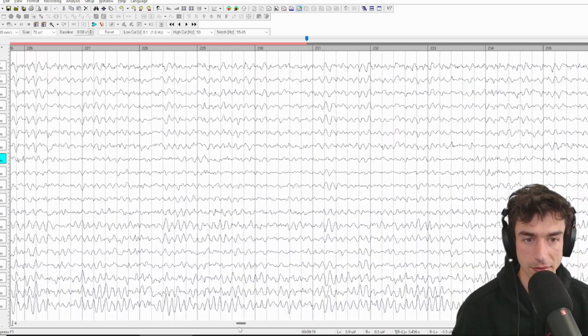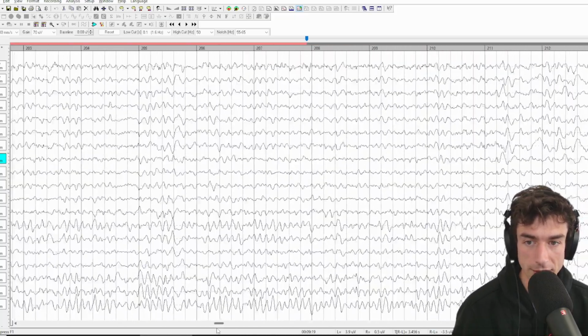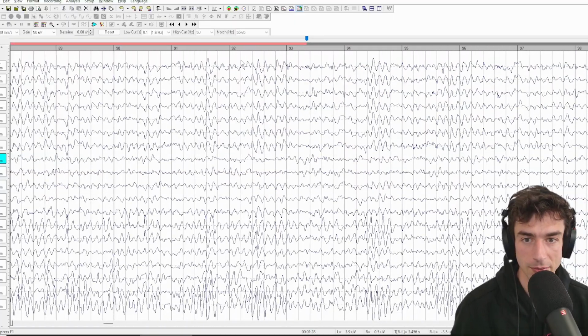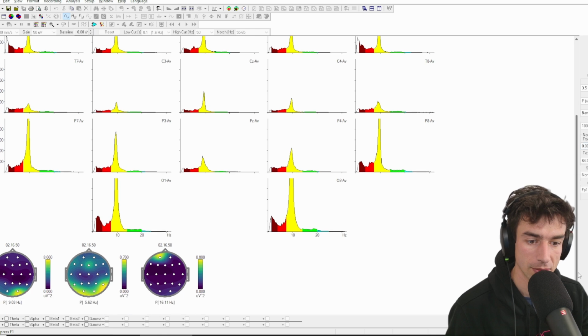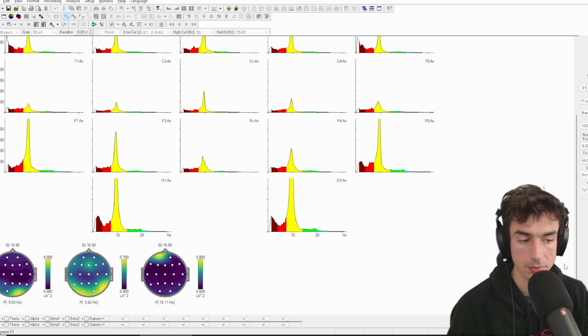So I'm inclined to believe that it's real, i.e. cortical, as opposed to a consistent muscle activity. And we do kind of see it at FP1. So that's interesting. There's possibly some frontal kind of tonic beta activity going on there. Although we're not sure about it.